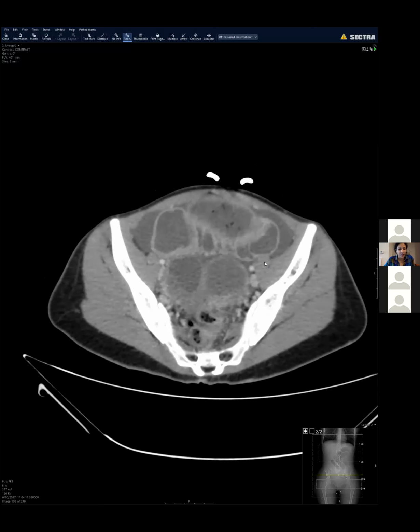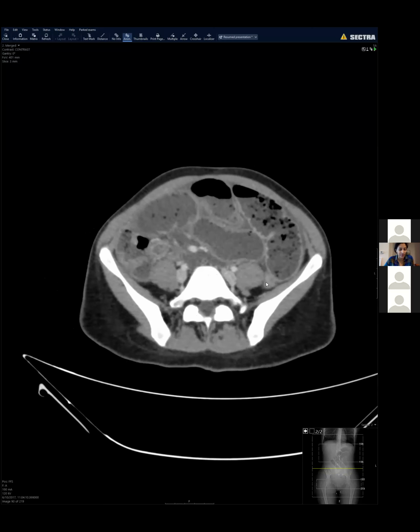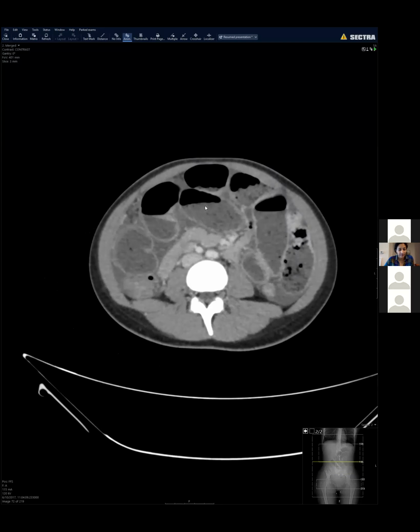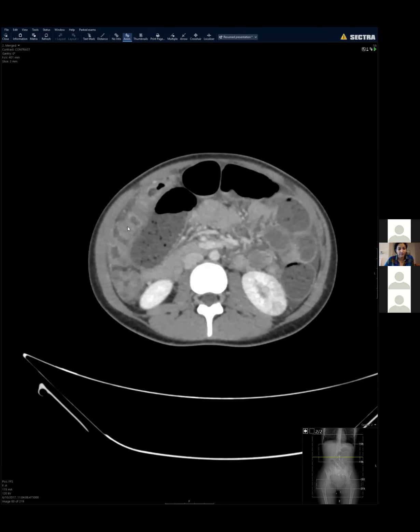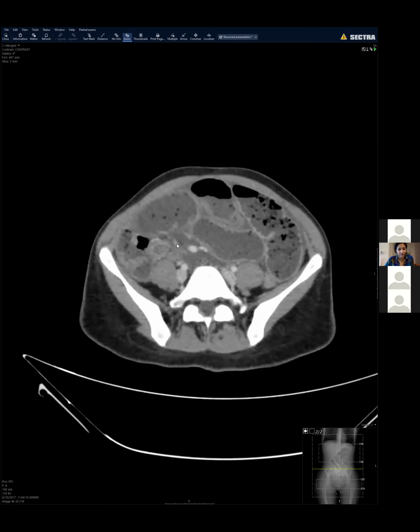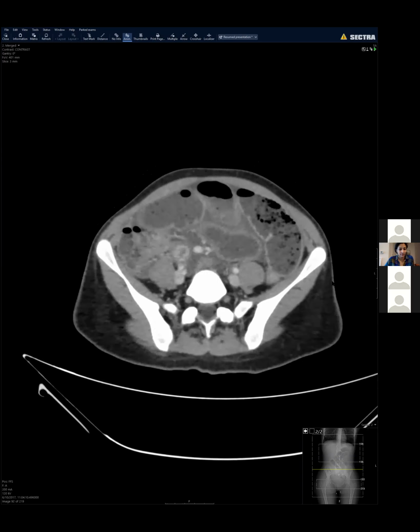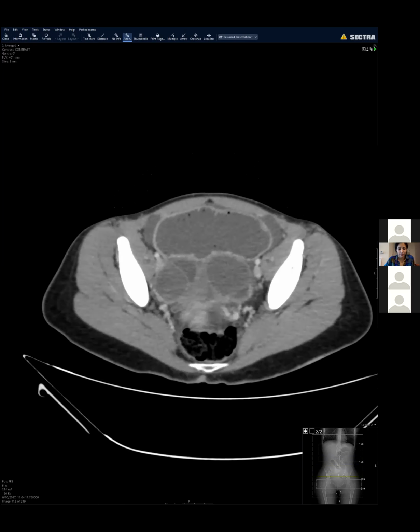So Roopa, here we also have some more guesses of carcinoid or neuroendocrine tumor, or maybe the nodal metastasis from there. Okay, all good thoughts. So here's transverse colon, collapsed. Here's ascending. Little bit of wall thickening, but the colon is mostly collapsed. So everything makes sense that whatever this is at the IC valve area with upstream small bowel obstruction. And then I'm going to scroll some more down through the pelvis for any additional thoughts.